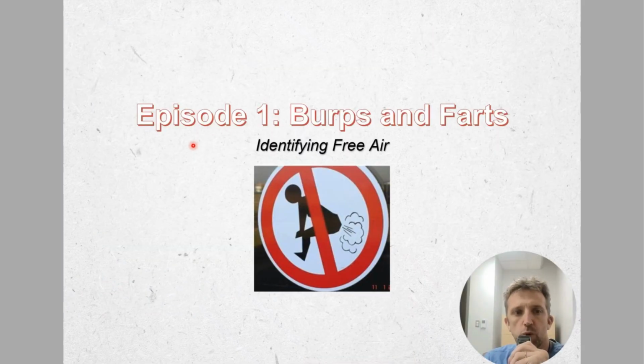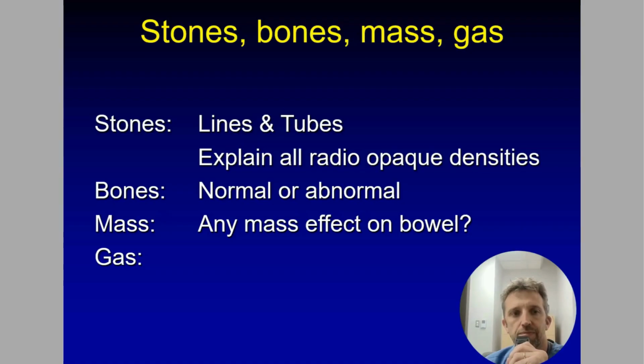In episode 1, we're talking about the law of burps and farts, looking for free air. So we're going to talk about reading an abdominal radiograph. It's important to have a systematic approach. Stones, bones, mass, and gas is how I like to do it.